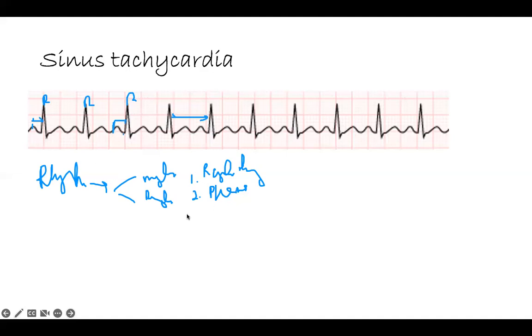So it's within normal because 0.04 times 3 is within normal limit. So I've had 3 checks. Then you look at your rate. How many? No, I did not tell you it's 6 seconds. So I have 1, 2, 3.